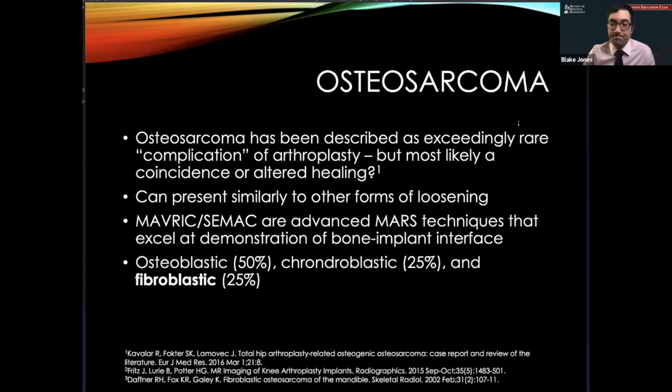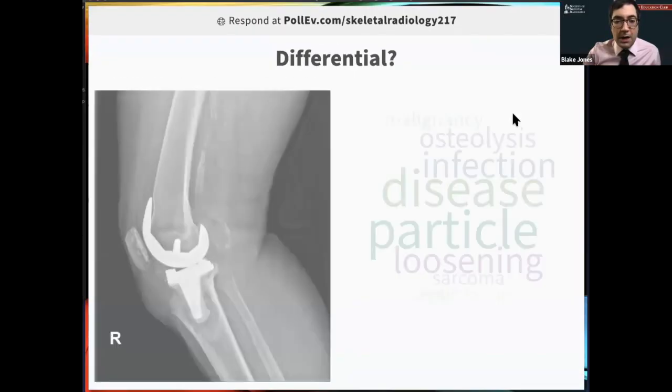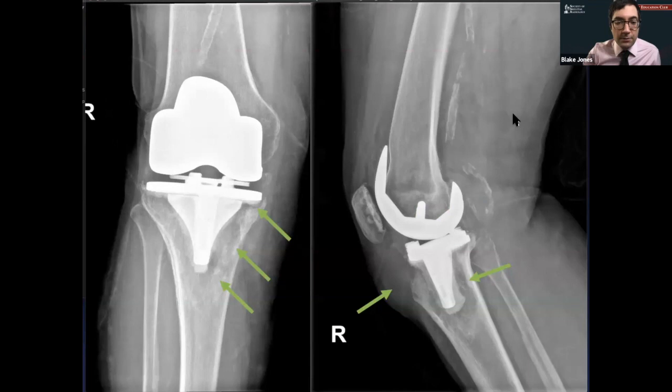Okay, we're pretty much out of time. There were two questions about the radiograph. One was that on the 2-year radiograph prior to presentation, there appears to be some periprosthetic lucency. Would it be reasonable to have suggested loosening or infection? And the other question was, did the soft tissue component show any osteoid matrix on the radiograph? So I don't know if you can page back. Yeah, I can. For this, the lateral would be the best.